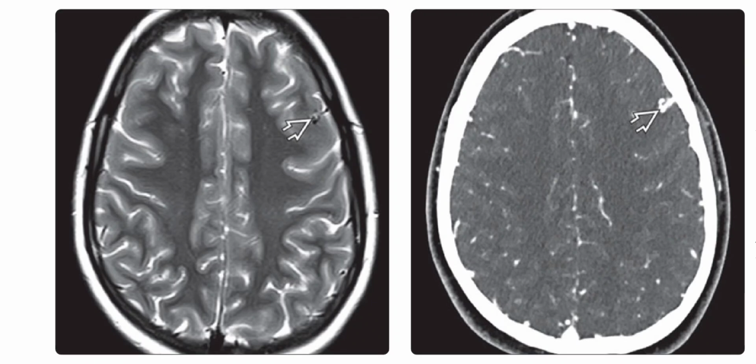Right is the axial CTA image, that is CT angiography image, obtained in the same patient, and it shows a well delineated tubular structure suggesting a vascular malformation. A pial arteriovenous fistula was found and resected at surgery. Arteriovenous fistulas are the least common of the three major types of cerebral vascular malformations that are associated with hereditary hemorrhagic telangiectasia.